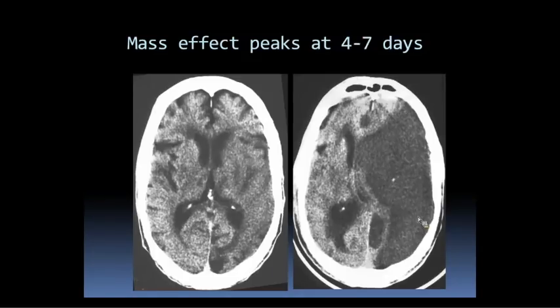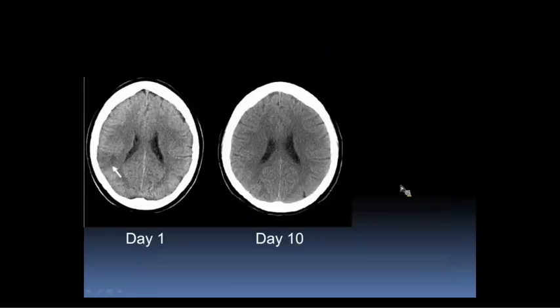And at this point, if you have a very large MCA infarct, you have to have neurosurgery involved and think about whether you want to do a craniectomy to decompress, to anticipate what's going to happen at 4 to 7 days. And here, clearly we have the diffuse edema. We also have complete effacement of the lateral ventricle. We have midline shift, subfalcine herniation. We most likely have uncal herniation as well at this point, although it's not on the slice.